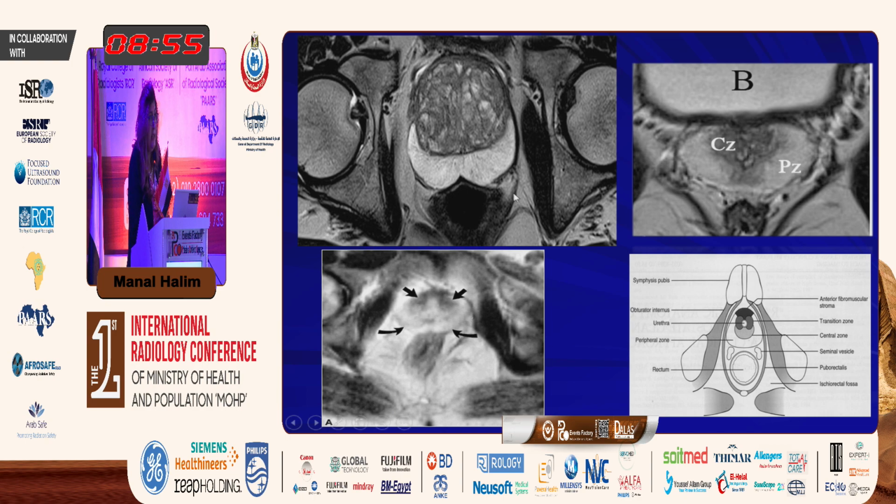Also, I want to say something about the capsule of the prostate. The capsule of the prostate is of low signal intensity. It's rather a pseudo capsule. It's not a true capsule. It's a condensation of fibromuscular tissues.